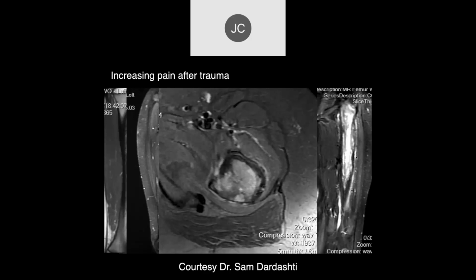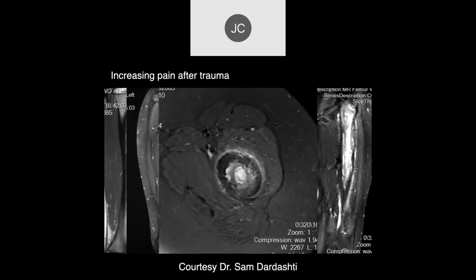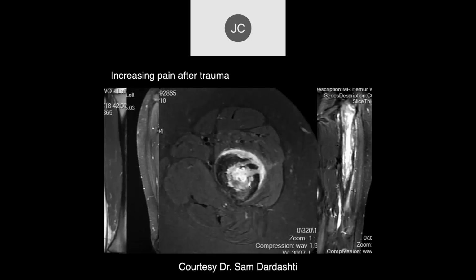You see a lot of edema in the surrounding subcutaneous tissues, and then this kind of chronic thickening and increased intensity really looks more like a chronic type of osteomyelitis with involvement of the cortical bone here, and a lot of cortical bone involvement. It doesn't look like the more discrete injuries that you'd see in an acute infection.